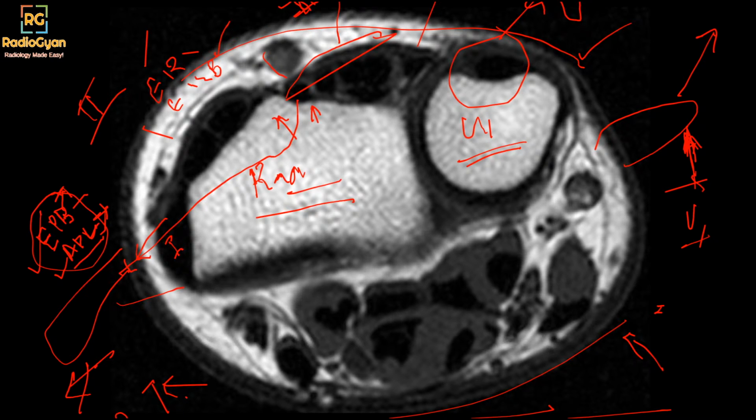Number 3 is extensor pollicis longus, which can be affected due to fractures of the Lister tubercle or chronic overuse at the distal tubercle. Compartment 4 has extensor digitorum tendons and extensor indicis. Tenosynovitis in this region is rare.